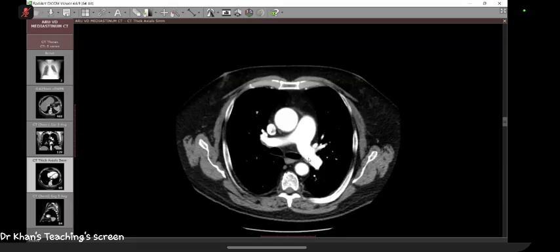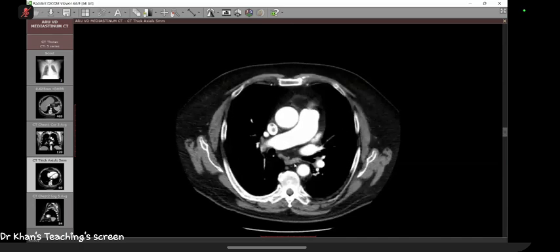On radiology, we are quite good. I'll teach you the science. But here, you can see that there is a fat plane. Look at this area, the angle between the aorta and the spine. Look at this fat. This has got normal fat. This fat is going to be obliterated. If it becomes obliterated, you call it a T4 tumor, right? Game changer.